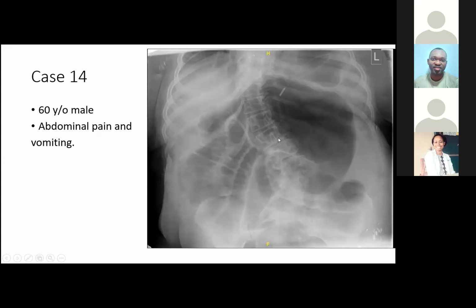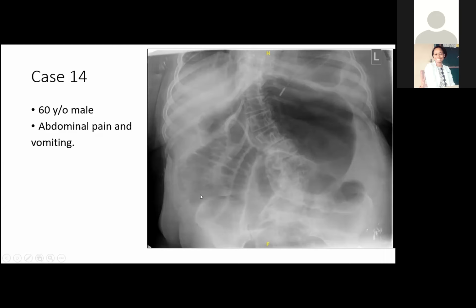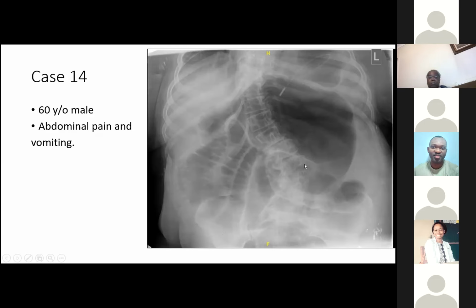This is actually a tricky X-ray abdomen, and so I'll just talk through that. So as you pointed out, this is small bowel distension. Again, you've got this complete stack of coins, valvulae conniventes, and what appears to be missing on the right side of the abdomen is you're not seeing a cecum or ascending colon, and you've got loops of bowel which appear to be here over the right side. And as I said, there's a nasogastric tube in situ. And if you look quite closely, you can actually make out a stomach up there, which is actually collapsed. And this structure here is separate to the stomach.